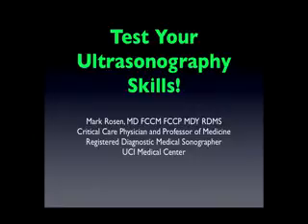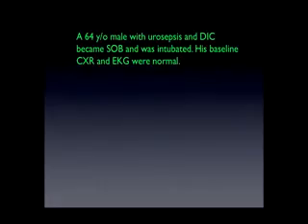decision making. Now, please be aware that there are many different ways to approach what is considered a complex case here. And by no means am I saying that this is the only way to approach the case. Again, the purpose is to show how an ultrasound, or in this case, more than one ultrasound, can influence clinical decision making. So we'll start off with the beginning of the case.